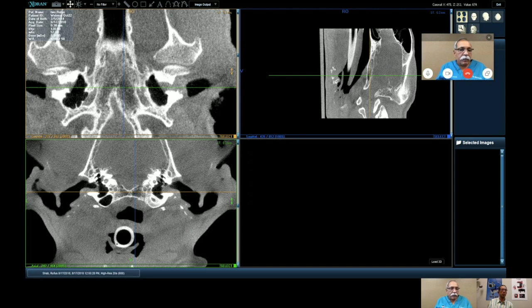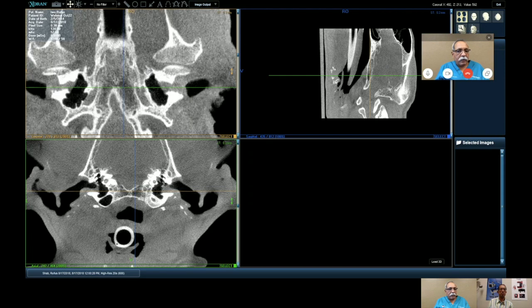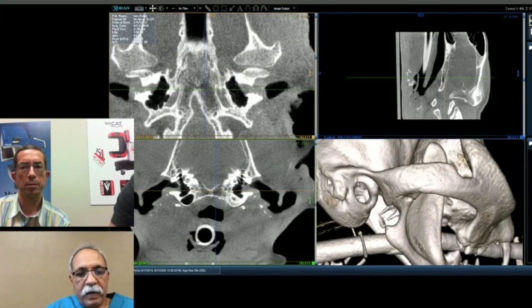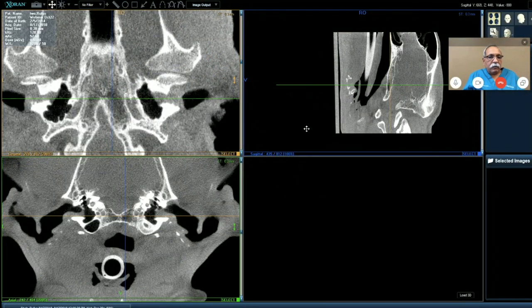The most important thing here is you want to look for any growth or obstruction in the nasopharynx. Quite often, the eustachian tube is blocked, and that creates a lot of problems in the middle ear. The middle ear is designed to drain the mucosal mucus, and it also allows air to go in and out. So any blockage of the eustachian tube will make a lot of sense.